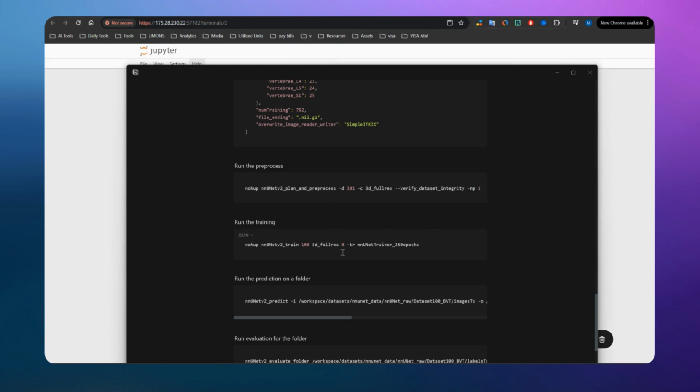If you want to do that, you can, but you need to make sure that the metrics shown by the model in the validation process are not the best ones, because the data that has been used for validation is the same one that has been used for training. So in this case, if you do want to use all of them, no issue. You can put all, so that you use most of your training datasets for the training. And then since you already have two other folders, the valid and the test sets, you can use one of them for the validation. But in reality, it will be testing, not validation, because it is not being used during the training. It will be used after the training, so it is just a kind of evaluation.